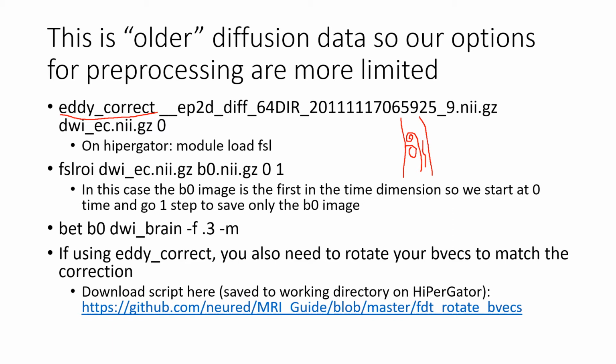But after you have your NIfTI file, you could have that renamed, but in my case I didn't rename it because I'm going to give an output here. So this is our input, so eddy correct, and then this is our input, and then here is our output. And sorry, my handwriting looks terrible using a mouse.